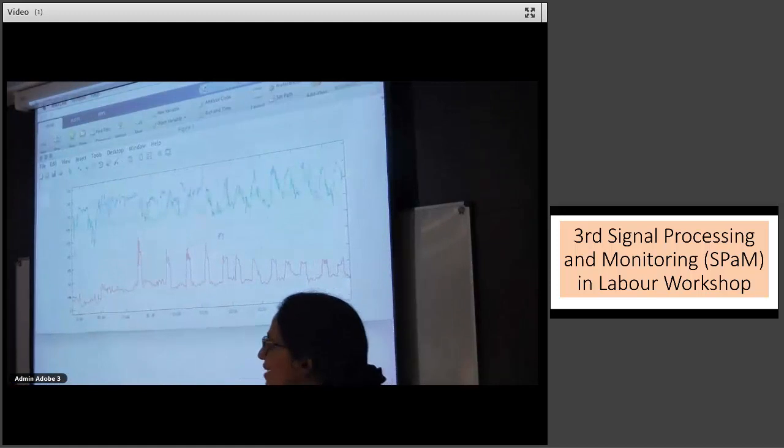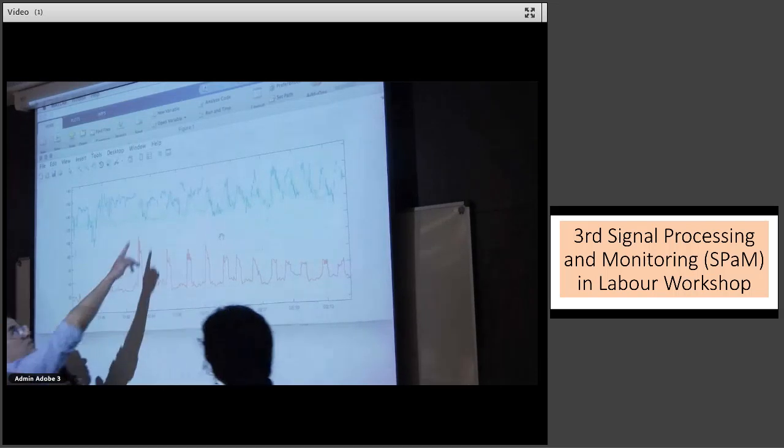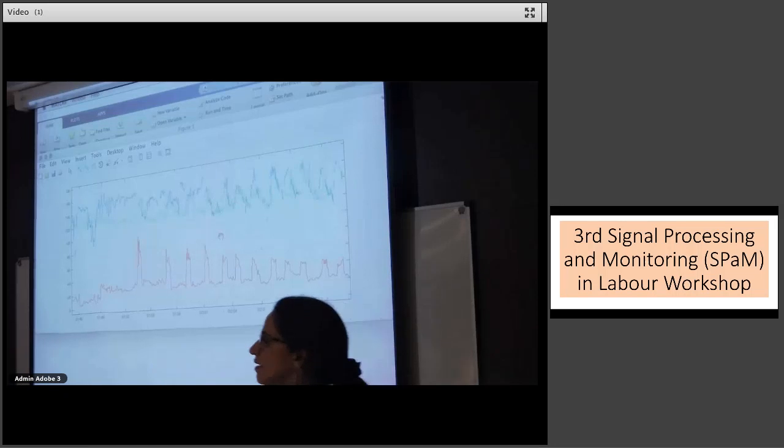Well, is there a better option? As an alert that says no baseline. Yeah, that's another option, definitely. Abstracting a baseline from X minutes ago. It's true, but it's the only way you can actually still identify accelerations and decelerations. If you find that's useful, well, here it probably doesn't make a lot of difference, but here, to identify these decelerations, it may be useful. To come up with alerts saying, repetitive variable decelerations or something. If we don't have the baseline, we can't calculate them.